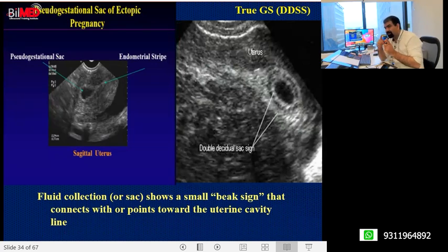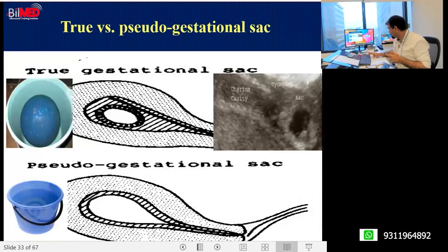Now see, there is something which is called suggestive, and there is something which is called ruling out. If I have an unobliterated uterine cavity, it is not merely suggesting something, it is ruling out each and everything. It is ruling out ectopic pregnancy. Whatever you have put in your basket is taken out of your basket and thrown in the dustbin.